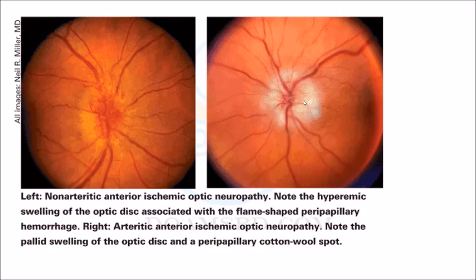We are not telling these are optic atrophy. The better word is optic neuropathy, and this is ischemic. Both are ischemic. One is non-arteritic, this one is arteritic. So we can expect this type of picture from giant cell arteritis, right? Polymyalgia rheumatica background. Very often you have to face such a question in the exam.